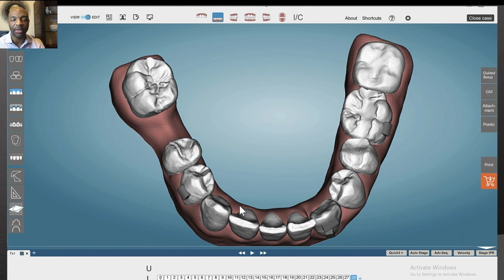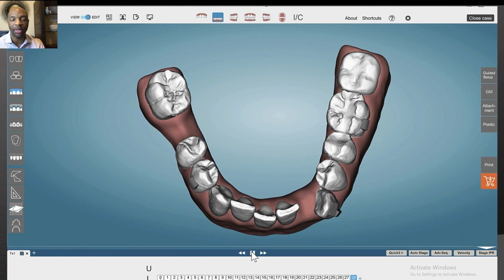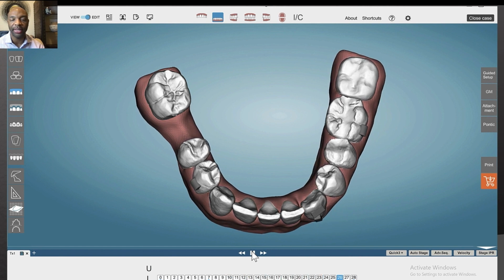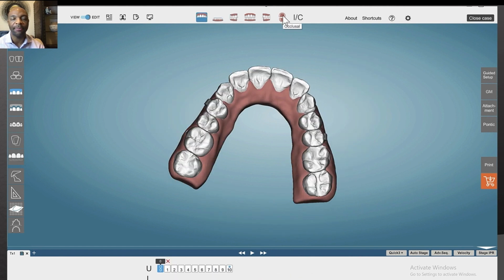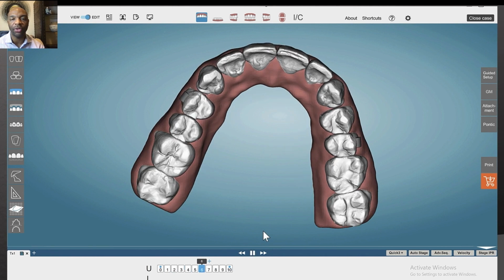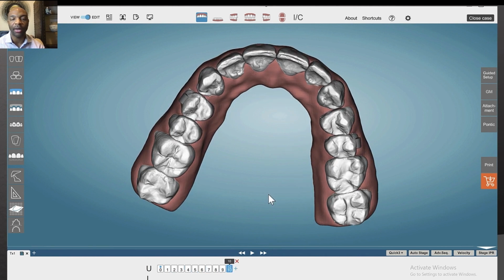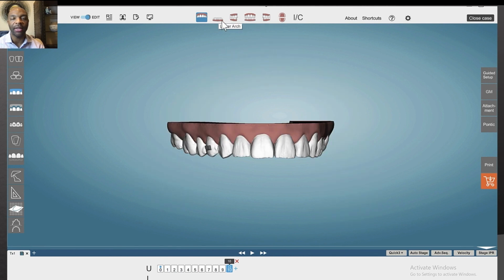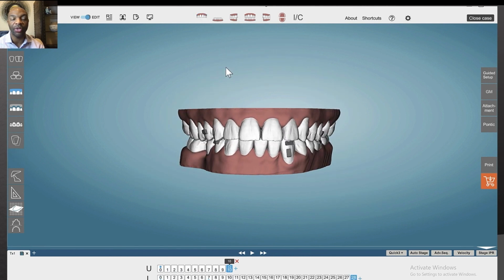And then again, I just lined up the rest of the lower 3 incisors and some of the posterior teeth just to get everything nice and lined up. And then in the upper, again, not a whole lot going on. That upper left 2 needed some work. And so we just wanted to line everything up and get it nice and spiffy. So just lining those laterals up, and you can see the occlusion in the setup is acceptable, at least to me it is. And so I was happy with this option.